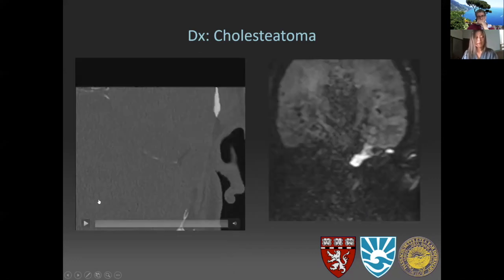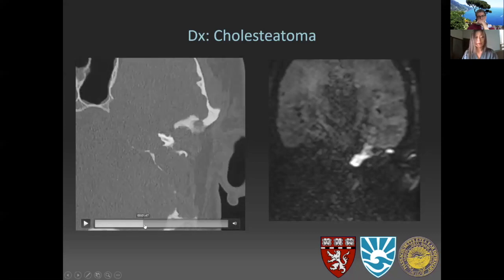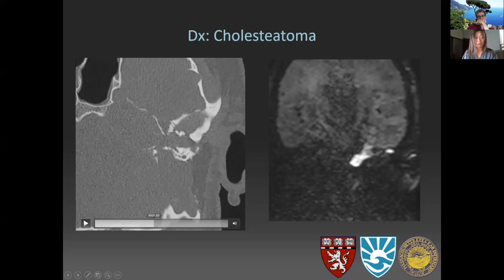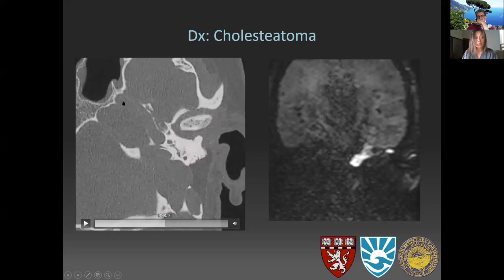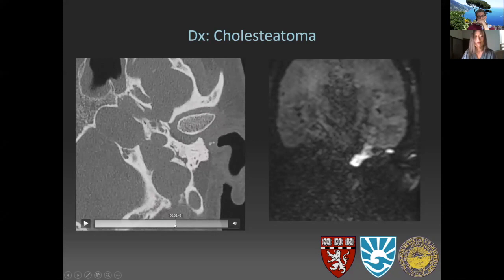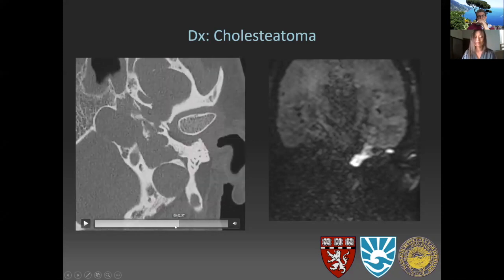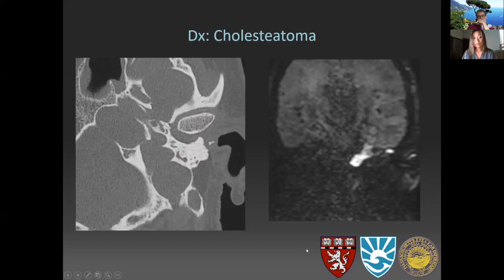This is another case that is really quite dramatic. When you first see this, you would be worried for some really bad malignancy, which is certainly possible, just chewing and eating into the external auditory canal. But there's also an expansile component here in the petrous apex, and Felice again gave this wonderful differential on lesions in the petrous apex, including cholesterogranuloma, and so on. In this case, there is restricted diffusion, so this was a cholesteatoma that was very destructive.